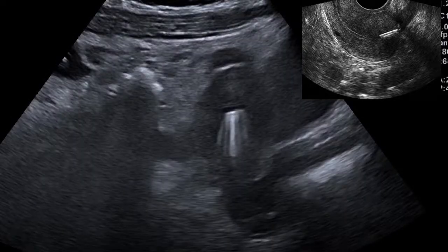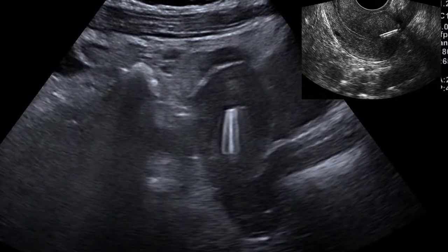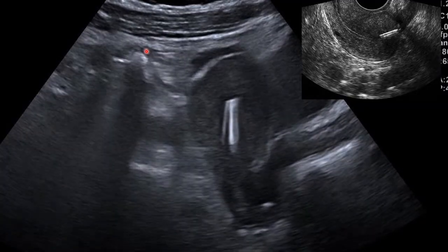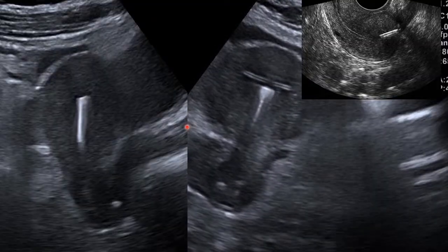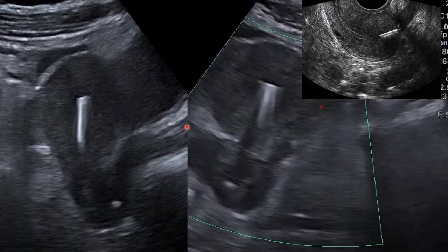So gastrointestinal complications can also cause the pain. In this case, that could possibly explain it, because you can see there's some bowel gas here, which is casting this dirty shadow there. So it could probably be due to bowel-related issues. So urinary tract pathology can also cause low abdominal pain, or it can be musculoskeletal related.